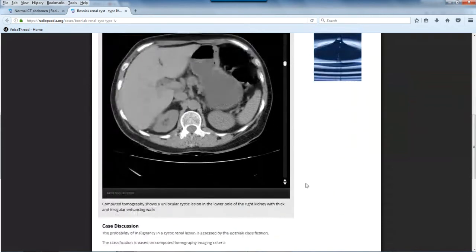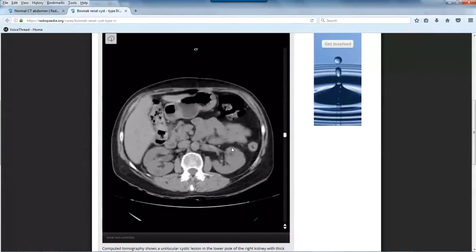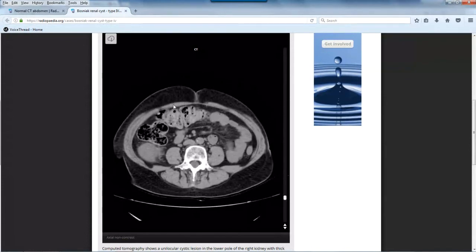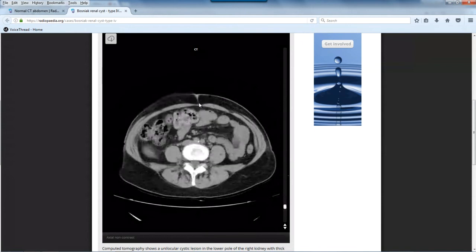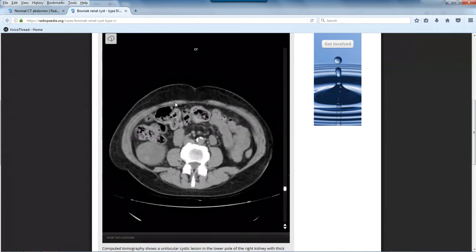So the last things that we have to look at are the abdominal wall muscles. The most important ones that I want you to be able to see are the rectus abdominis muscles right here. They are just the series of muscles that lie just lateral to the midline. This is your midline right here. And then this band of fibers here is your linea alba. Sits just below the skin. This is like subcutaneous fat, and this is the skin up here. This is muscle, this darker gray. That's your rectus abdominis muscles.